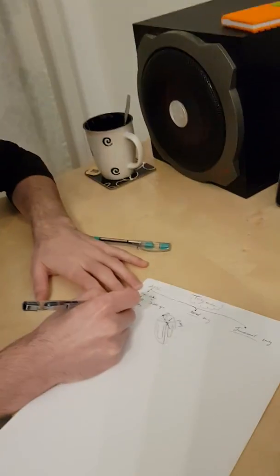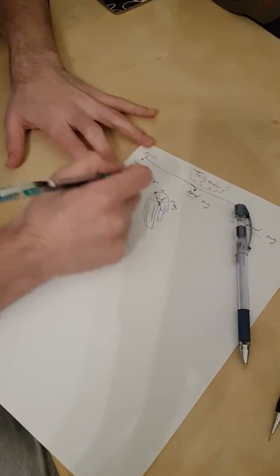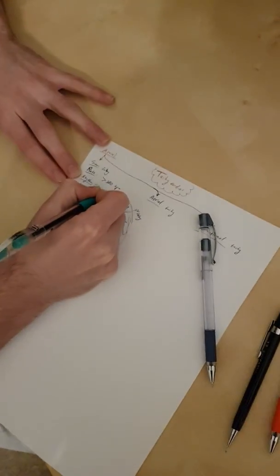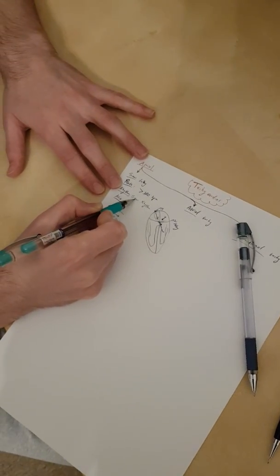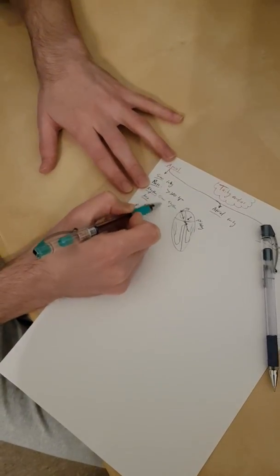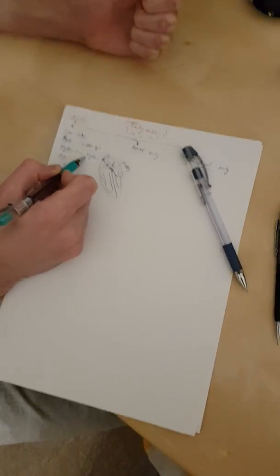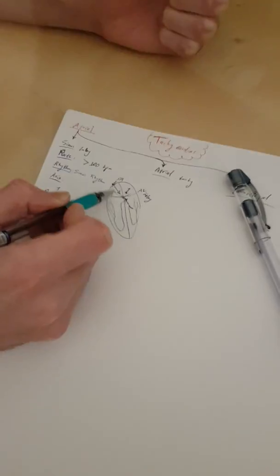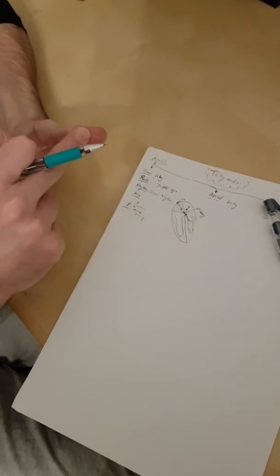Now, going back to this one, we said there are three criteria for a sinus rhythm. So the rhythm will be here a sinus rhythm. Okay, so rhythm is sinus rhythm, but it's a sinus tachycardia. So here's the thing. So far, until we got to this point that it's a sinus rhythm, we said that, first of all, the RR are regular. We keep getting impulses at the same rate, same intervals, same times. So we checked already for RR.